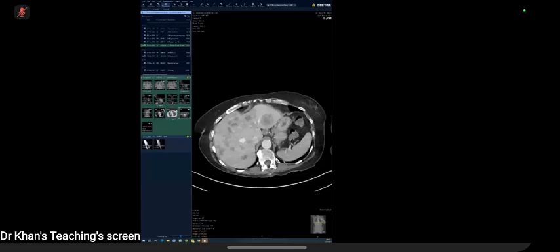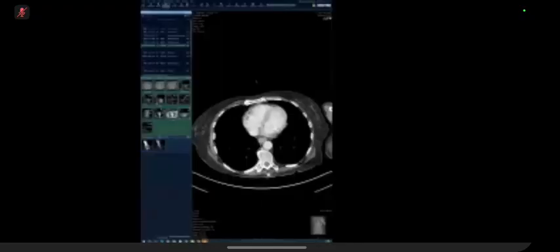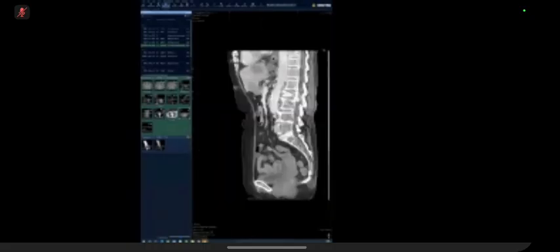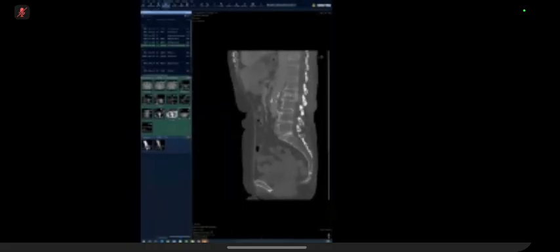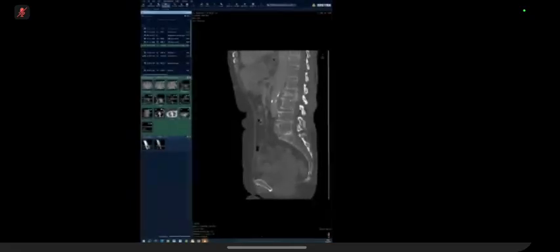You've picked one bone lesion. You forgot to say that I'm going to look for bone metastasis as well, because nobody's going to die from a pathological arm fracture, but they will get paralyzed from a metastatic spine. So this one here, you should be talking about, or if you can't pick it, you should say it out loud. I would like to exclude further bone metastasis.